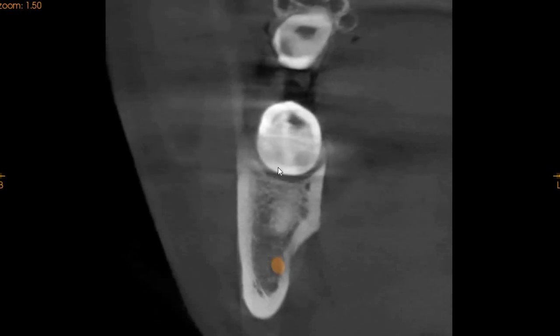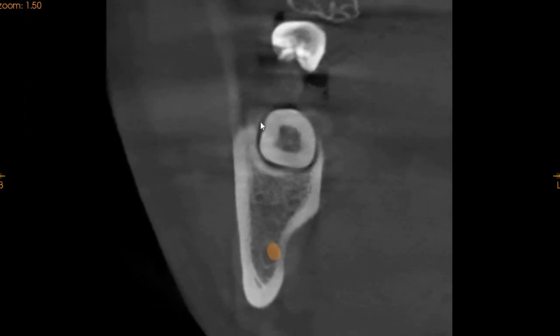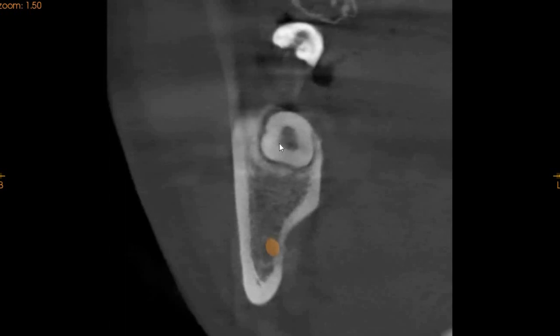As we are moving distally, we can see that the tooth is so far superficial. There is no buccal or lingual cortical coverage. But as we are moving towards the ramus, this is where the ramus starts and this is the pulp chamber. We have a rim of radiolucency. We do not see any ankylosis yet.